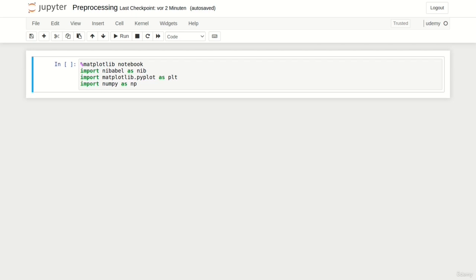In addition, as usual, we include the link to the dataset as well as the corresponding license in the Jupyter notebook. To address this issue, we use the following libraries. As all files in the IXI dataset are niftis, we will use nibabel to load them. Of course, we can use matplotlib to visualize some slices and numpy to perform the matrix vector calculations. Additionally, we use the magic command %matplotlib notebook, which increases the overall usability of our plots.